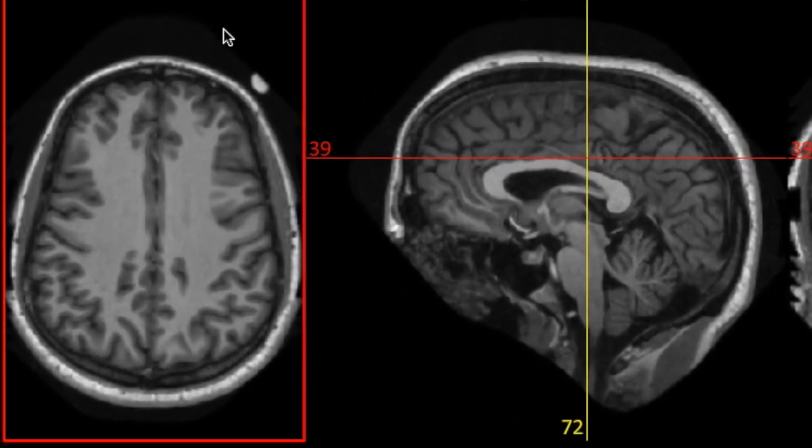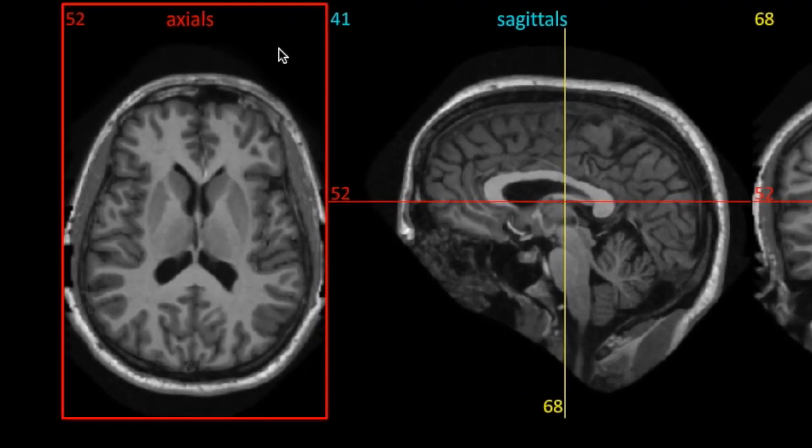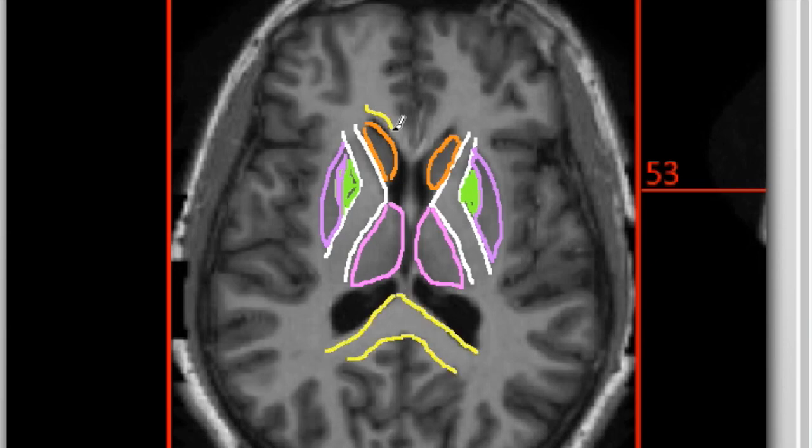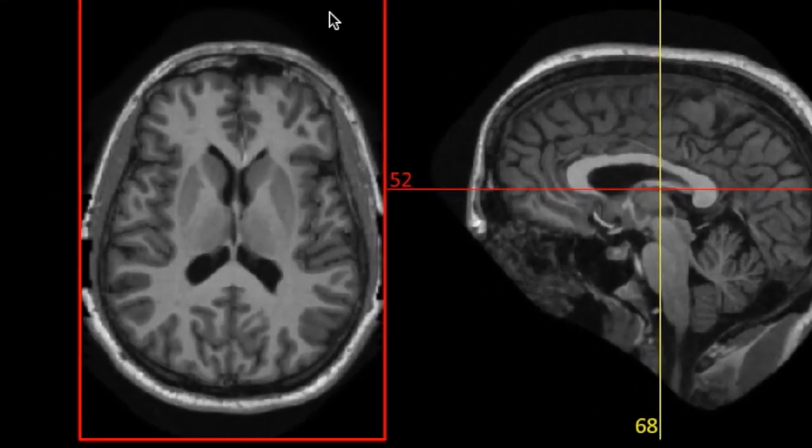Alright, so that's it for the axial sections above the brainstem. Hopefully now you can tell when you're above corpus callosum or below it in the area of the deep nuclei and diencephalon. Remember, always start at the midline and use the lateral ventricle shape or lack thereof to determine what level the image is from.